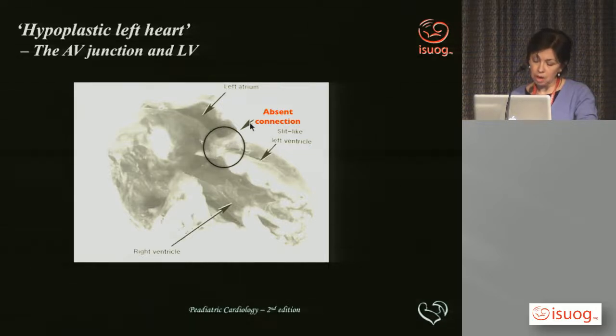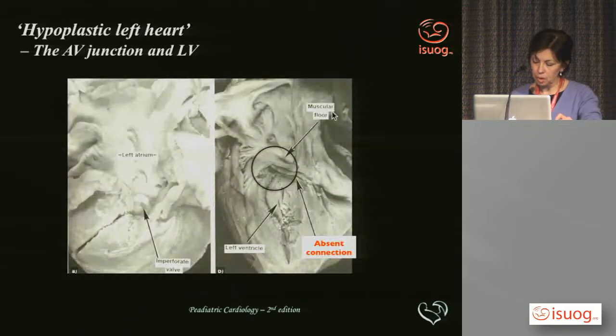Where this arrow is, you could put your hand through there, like that, and lift up, and there's a wedge there. So you could separate the atrium and the ventricles and show here that there isn't anything there. And that area sometimes is clear on the ultrasound. It appears as a very bright, echo-dense area because there is some fatty tissue around here, the atrioventricular groove.